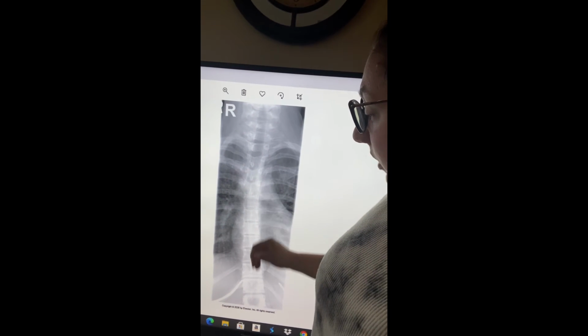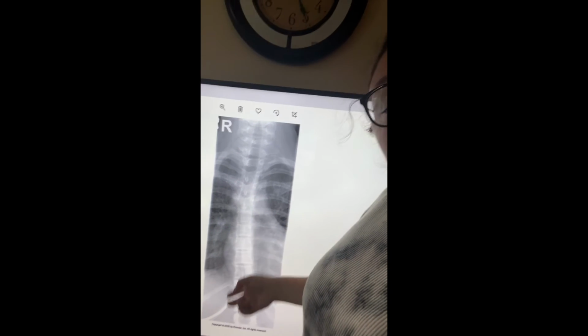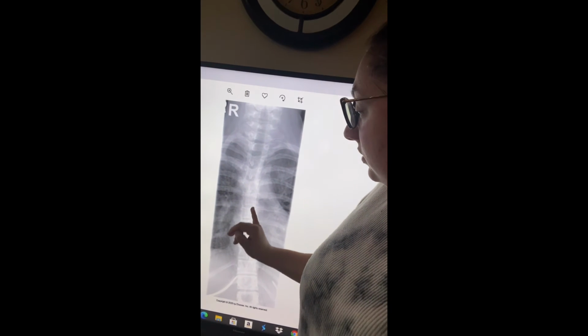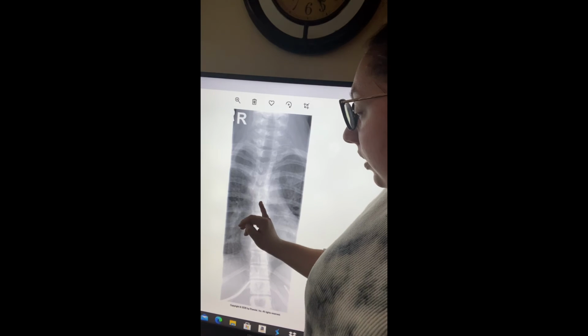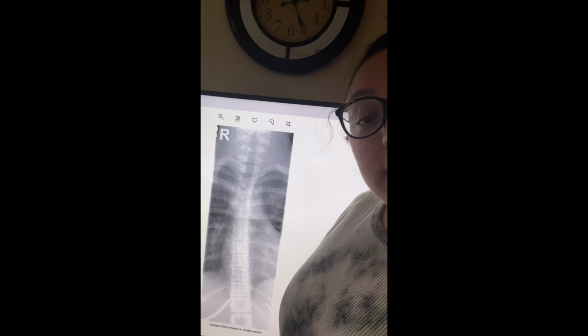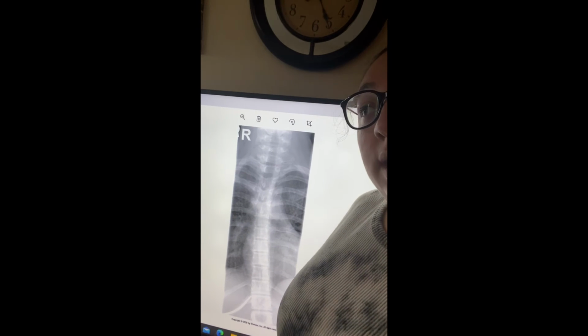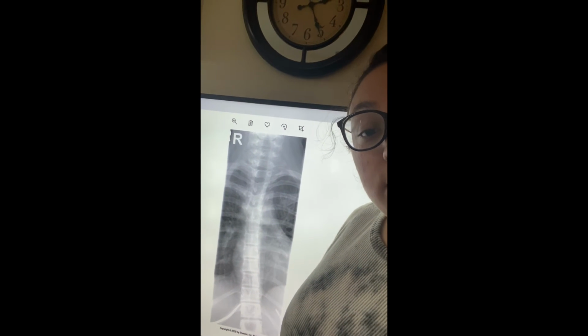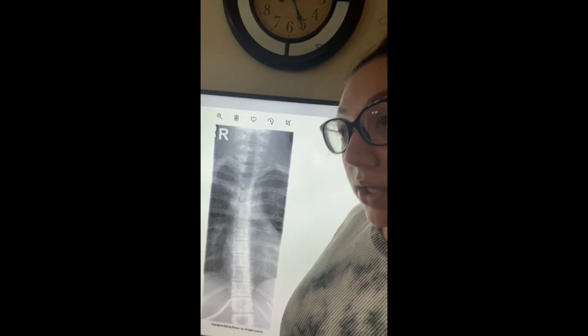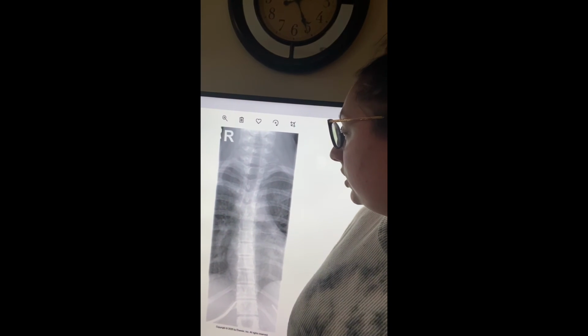You lose your spinous processes down the middle. This could also be due to exposure error. The lower T-spine definitely wasn't exposed properly. A way to fix that is you can increase your technique and use the anode heel effect, which is you put the thicker part underneath the cathode. So that could also help your image.